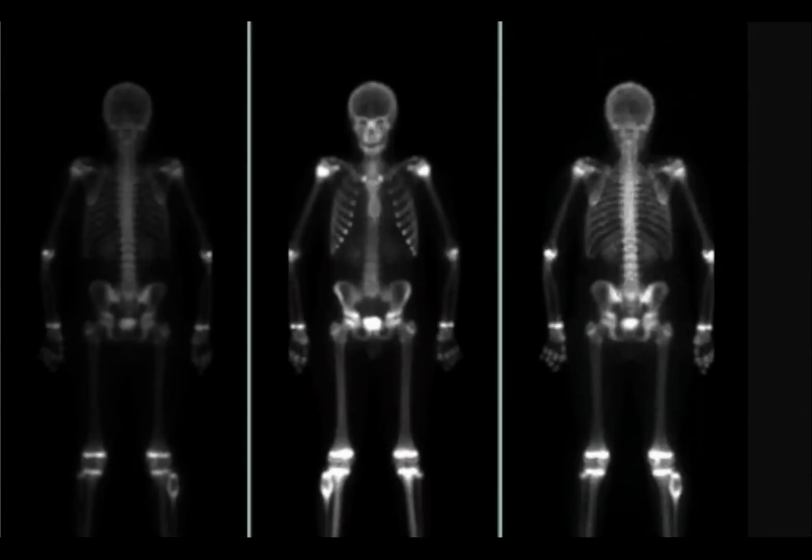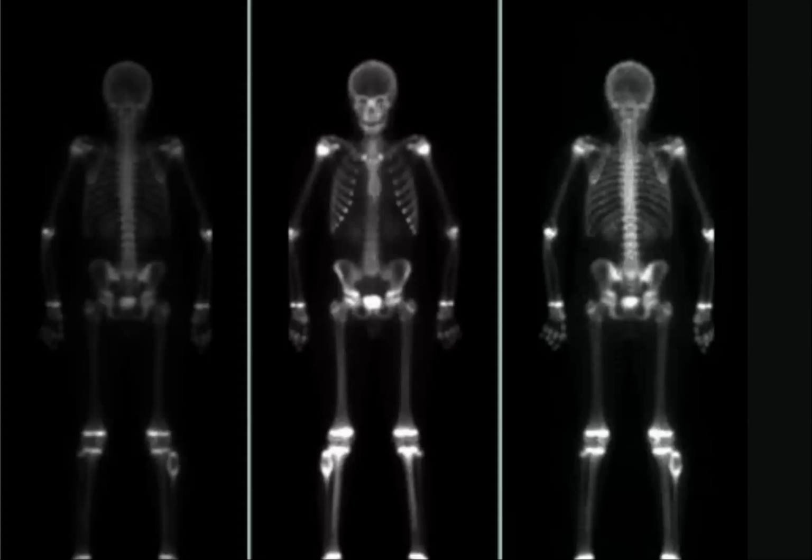What about these patients? So these are early and delayed phase frontal and posterior views of a bone scan, in which I can appreciate that there is abnormal uptake in the proximal fibular region, with a central area of low uptake, and it appears very well defined.